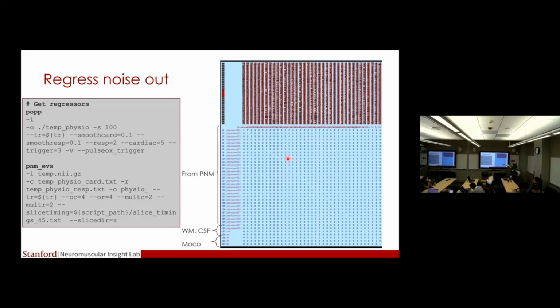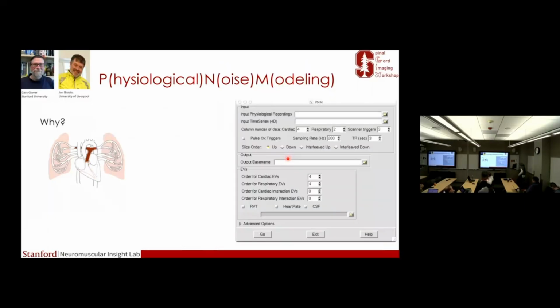Yes, and then you can just also script it so you don't have to go through the hassle of using the GUI each time. But I didn't know that. Oh yeah, it's inbuilt. So if you write a capital P and small nm, it should open this. And what does it ask you to input?